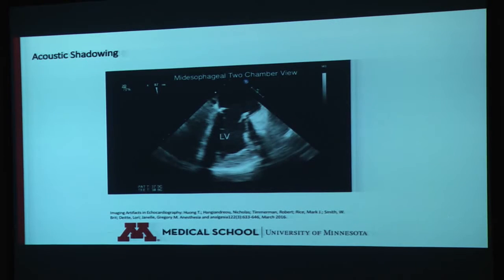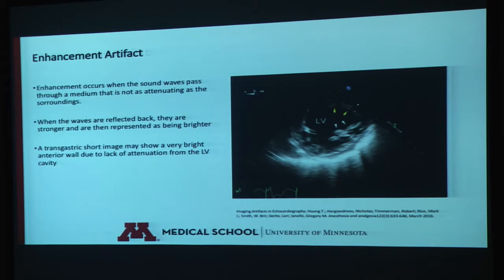Okay. And then the next artifact that we talk about is enhancement artifact. So, like I said, one of the assumptions that the machine makes is that the sound waves are attenuated equally as they go deeper into the tissues. When that assumption is broken, for example, when you have some waves that are attenuated less than other waves, you have this enhancement artifact.